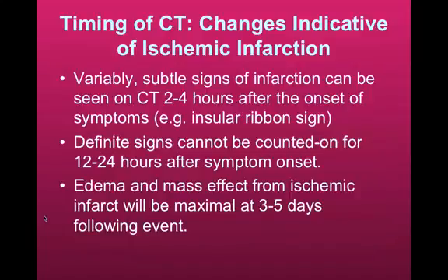With the infarcts, I kind of alluded to it. If you start seeing infarct changes on the CT scan, the infarct is probably 3, 4, 5 hours already in its age. So when people are telling you it just started 20 minutes ago, it's like, no, there's something wrong with this story. Let's go back and get some more history, because someone's got something confused. Remember, a lot of people, when you ask about when was the last normal, they'll tell you when they found mama, which is not what you want to know. That's totally uninteresting. When was the last time mama was normal? That's what you want to know.